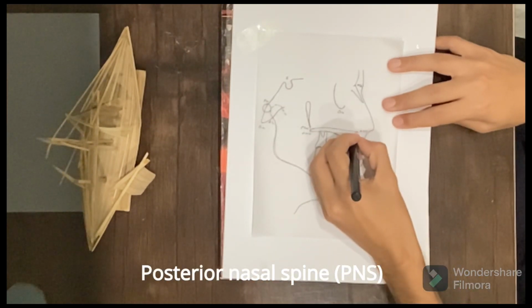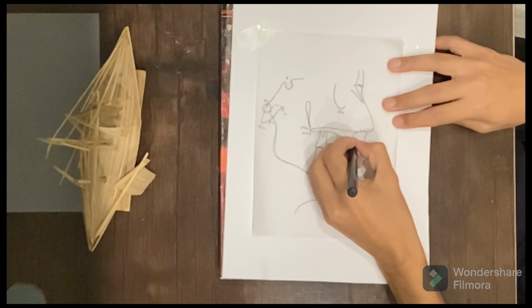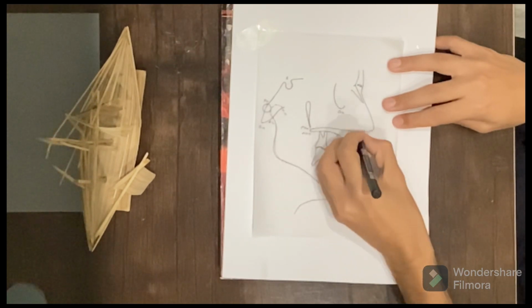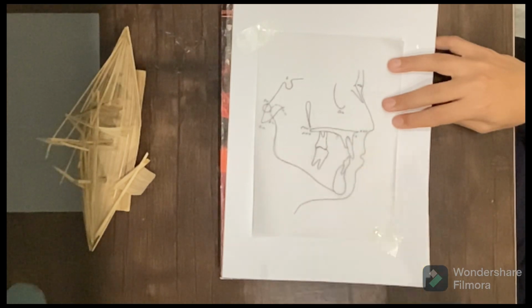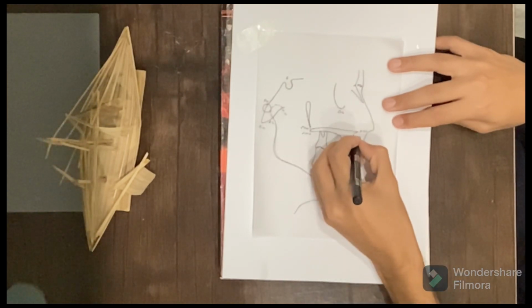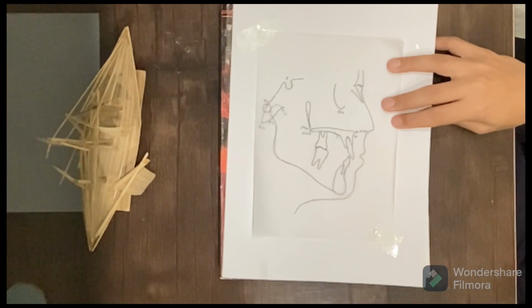And then there is a concavity present at the labial cortical bone of the palate of the maxilla, which is marked as point A. So this point is the deepest point on the concavity of the contour between ANS and the labial cortical plate of the most labially placed maxillary central incisor.